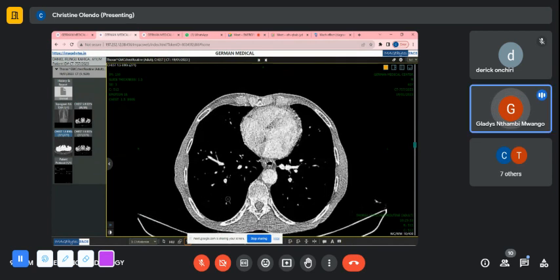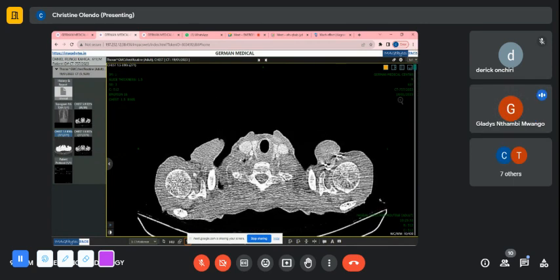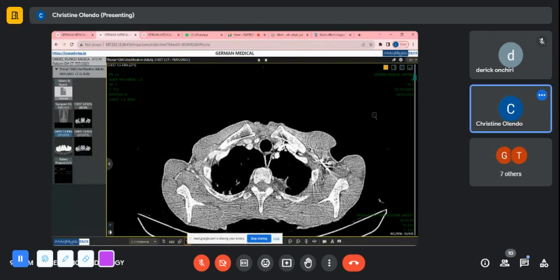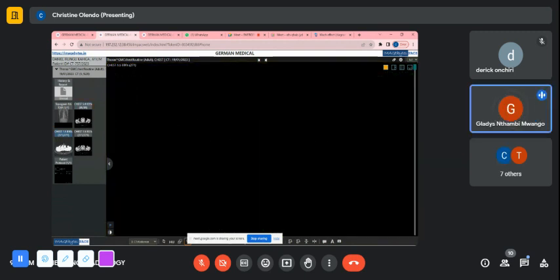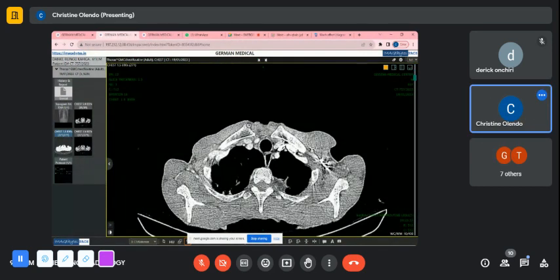Okay, so they definitely did lung settings. Yes. Okay, let's go up. Go down slowly now. Christine, is there a mediastinal window? Yes, doesn't have... Is the image next to the topogram? This one, but here's the mass on this one. Yeah, there's something there. There's actually something there. Yeah. Pleural based. Yes. This one here, and the Hounsfield units on the center.